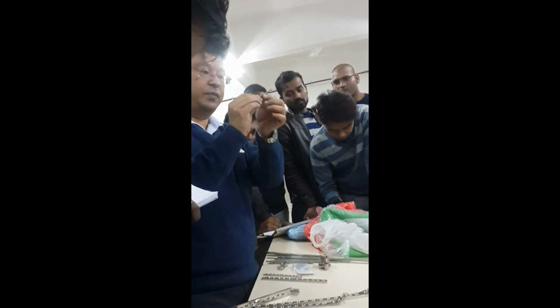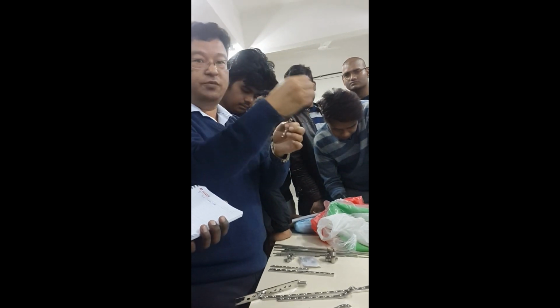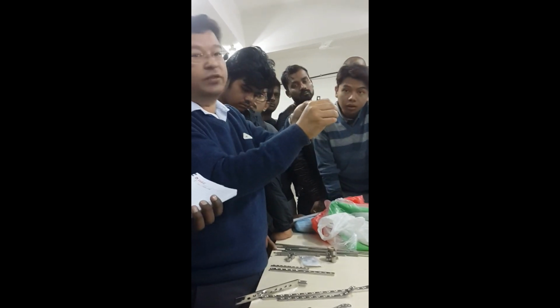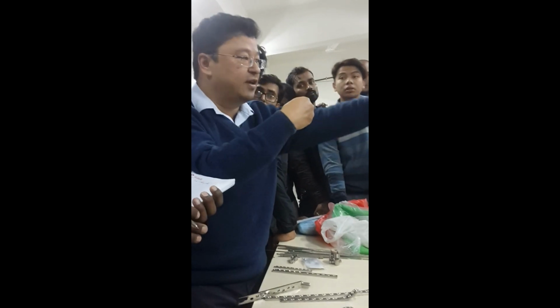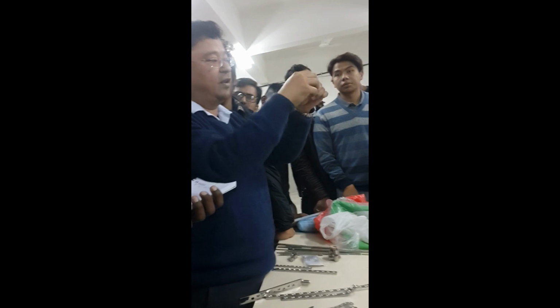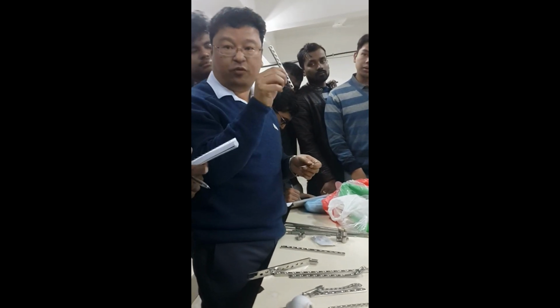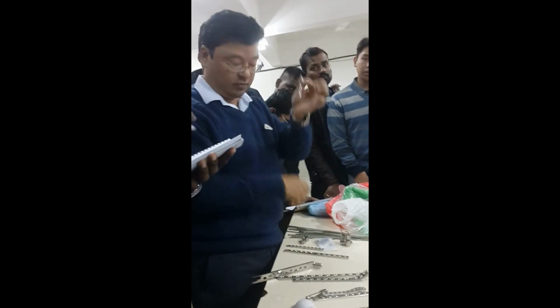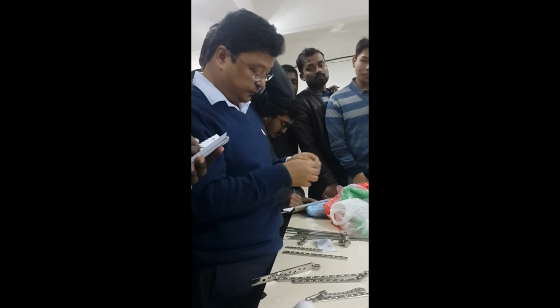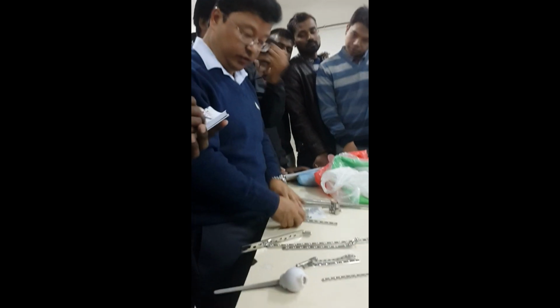DCP is more thick, and this will be curved like this. It is called 1/3 tubular because it is cut out as a third of a tube, like a pipe. It can be bent even by hand. For ulna and fibula, where the bone is very superficial, if you apply a DCP it will be very prominent, so you apply this. 1/3 tubular plate, for fibula.